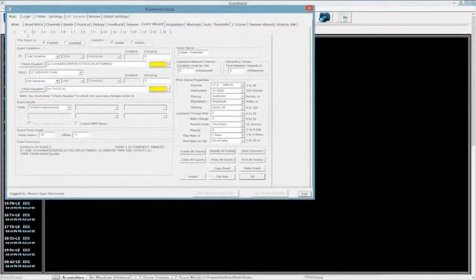Well, let's go to the next one. Oh, well, this is where we have one of those other things. If that same exact equation is greater than my upper threshold, well, I don't want event sounds to occur. So we're going to inhibit event sounds.